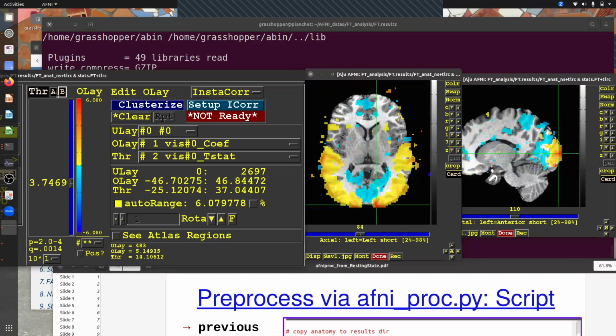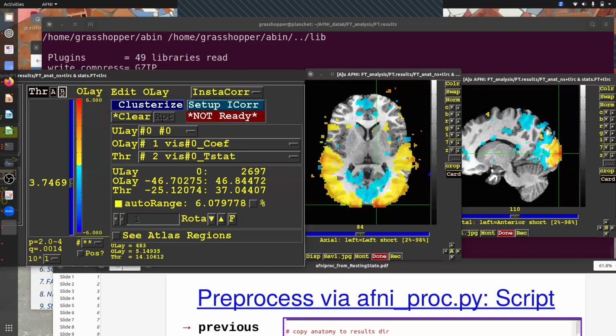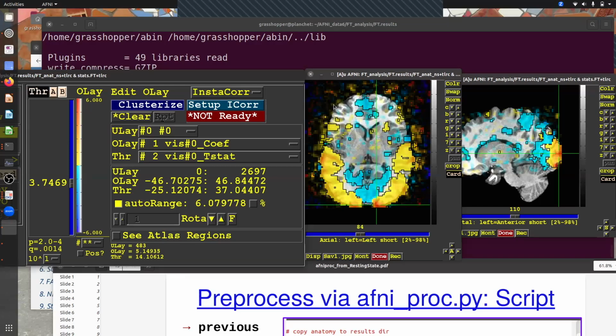When we look at our data and go through for sanity checks, this is something we would do. Transparent thresholding means, instead of just hiding absolutely everything that's below threshold, even if it's 0.00001 below threshold, we let its opacity fade as it gets further and further from threshold. It's like if you put your hand below water, you can still see it, but as your hand goes further and further below water, it starts to fade away. It's that exact same thing, just with statistics instead of your hand. And to put extra emphasis on things that are above threshold, we can highlight them.